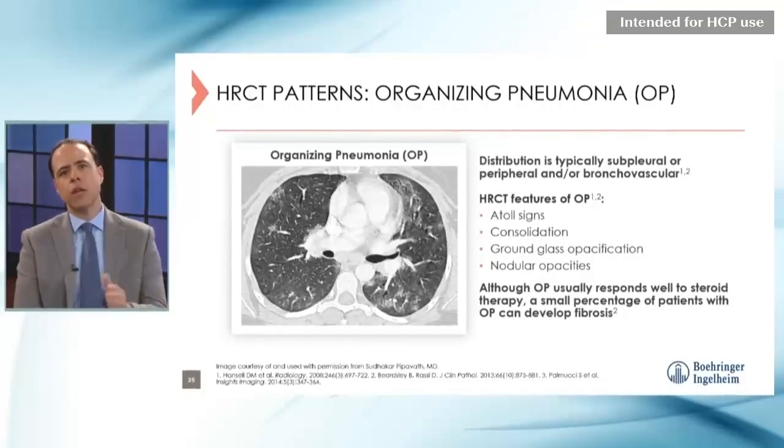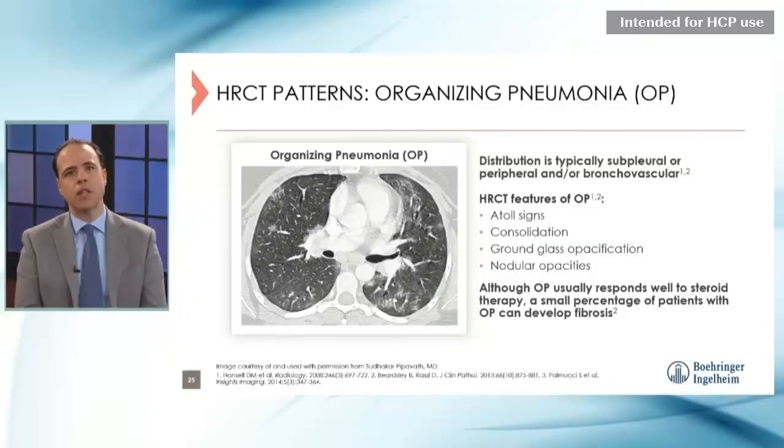So we've seen three other ways the lung can become abnormal in interstitial lung disease that's not typical for fibrosis. We've seen ground glass change, we've seen air trapping, and we've seen sublobar consolidation and the atoll sign. Those are things that would move you away from the UIP diagnosis. And now I'll turn it back over to Virginia to recap autoimmune ILD.